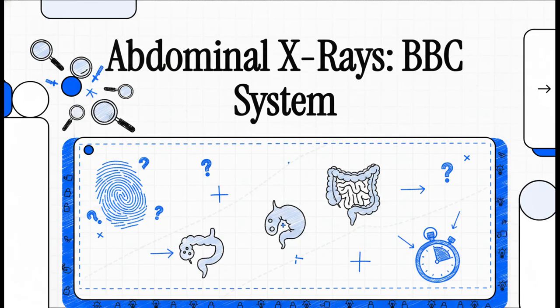Welcome to this explainer, where we're going to act as medical detectives. Interpreting plain abdominal radiographs can feel, well, a bit daunting, right? It's like looking at a chaotic mess of shadows. But it really doesn't have to be.